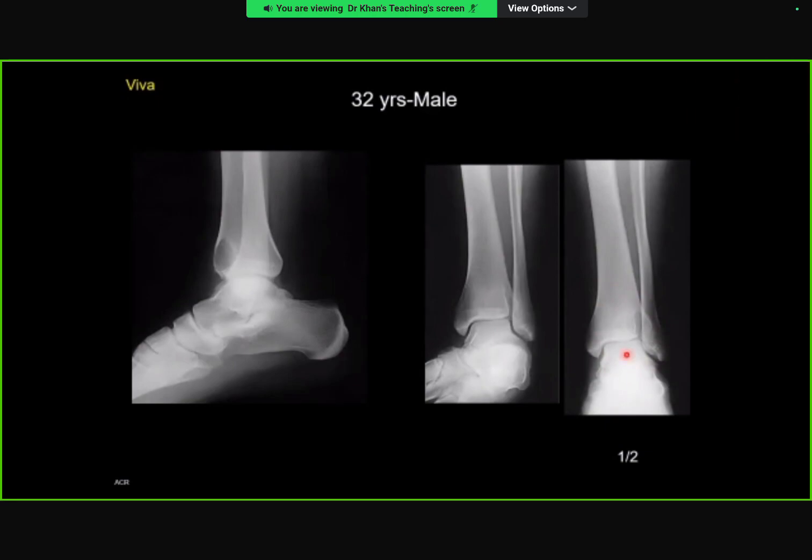Yeah. So it is a subarticular location, so I would consider giant cell tumor as well because the epiphyses are closed. Excellent. We stop here. The learning point here is that it was difficult in this case. Your eyes are picking up this as the articular surface. Actually, this view tells you that the articular surface is slightly proximal, so it is projected like this. Once you pick up that it has gone to the epiphysis, your differential becomes different, and that was the correct answer. Okay, well done.